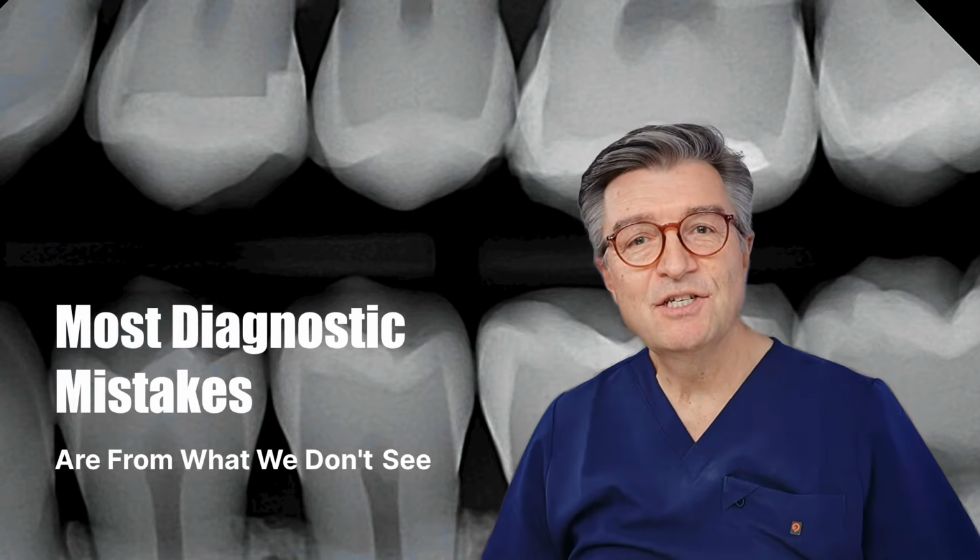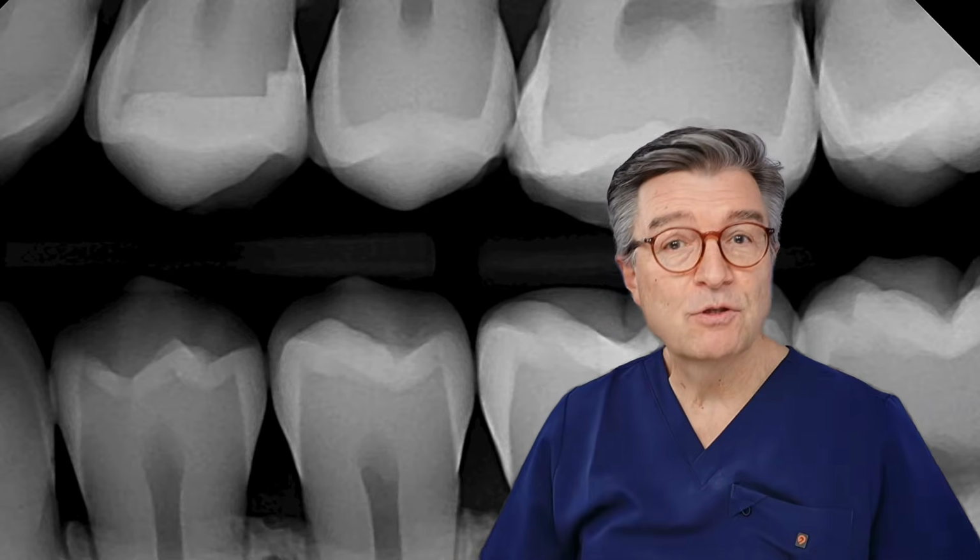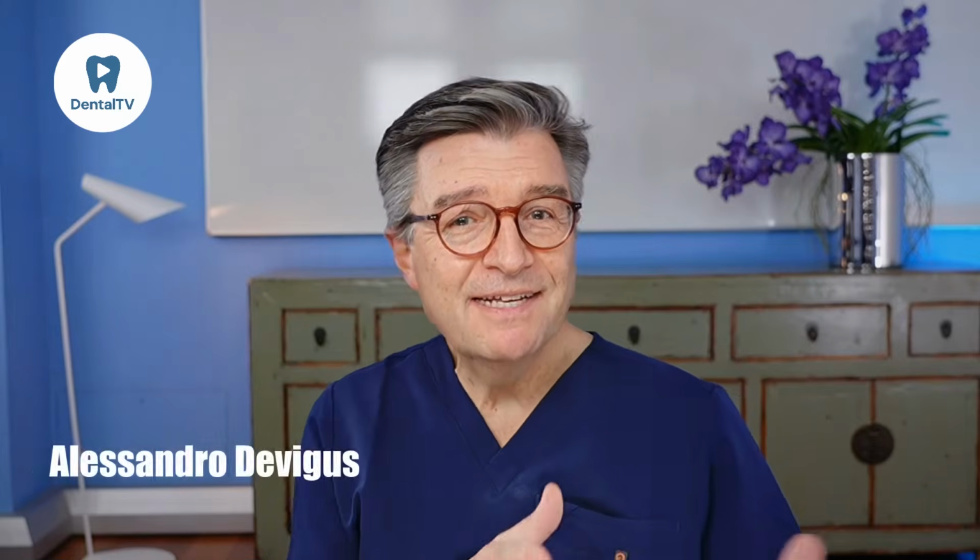What if I told you that most diagnostic mistakes in dentistry don't come from what we do, but from what we don't see on our 2D x-rays? And here's the surprising part. Every dentist learned 2D radiology in dental school, but very few learned how to interpret images with clinical confidence.